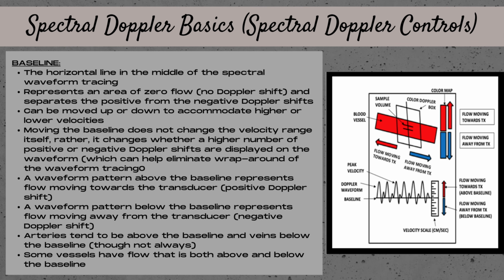When using spectral Doppler, the baseline is the horizontal line in the middle of the spectral waveform tracing. And this represents an area of zero flow, or no Doppler shift.